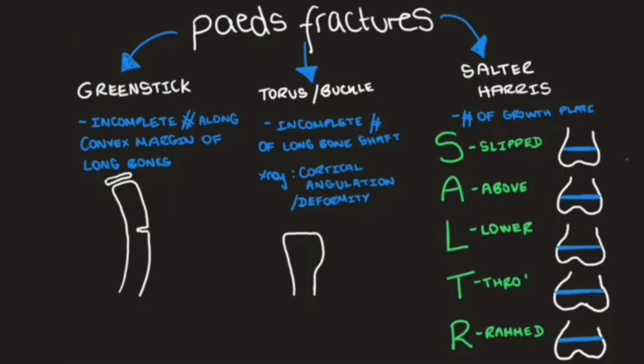So here we've done a whistle-stop tour of the common types of fracture patterns that you see in the paediatric population that you don't see in the adult population, and I hope it's been useful.